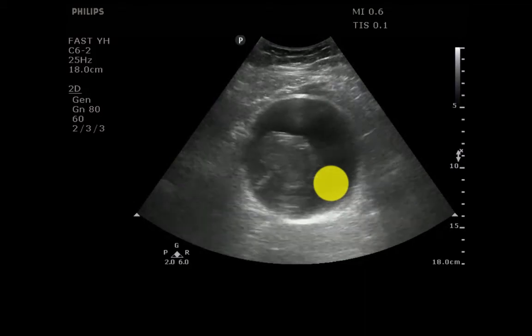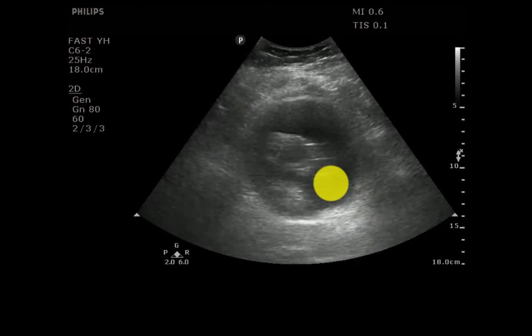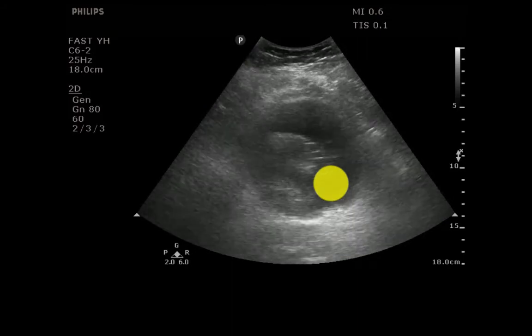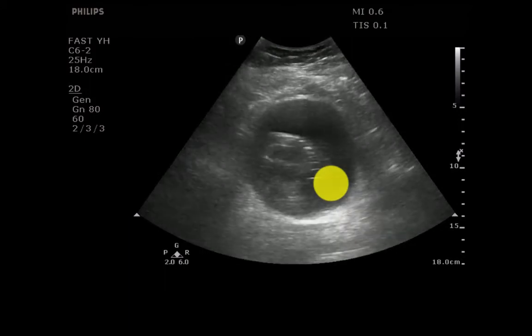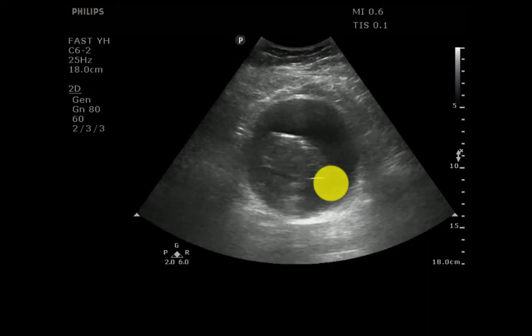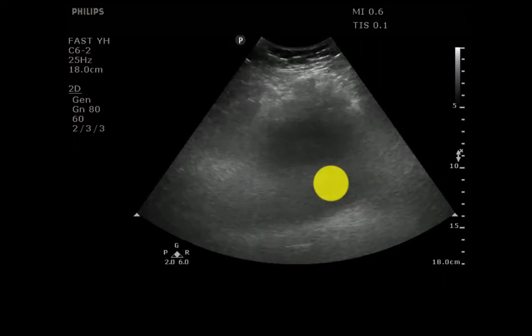One of my colleagues had a case just like this. He had a patient that rolled in to his emergency department. He plopped the ultrasound transducer down. The guy was rolling around, complaining of abdominal and back pain. He saw something that looked very much like this, and he called and transferred the patient out with a diagnosis of the symptomatic, if not ruptured, AAA.